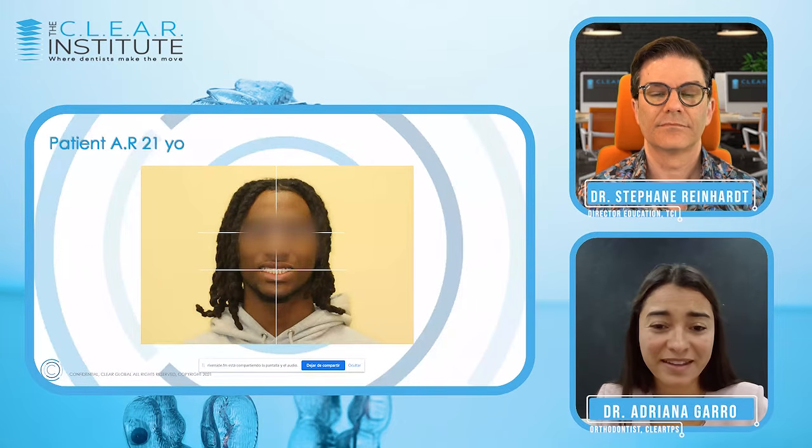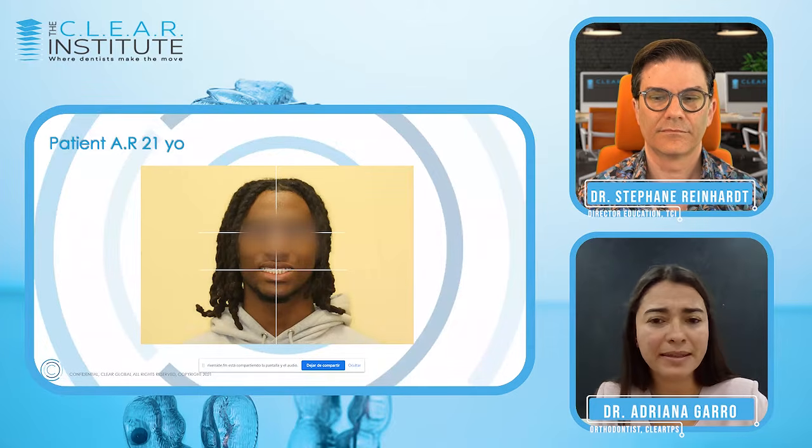It's completely different. So in this image, we see Andrew smiling, and it's more apparent that his chin, and he has a little bit of hair on the chin, but we can see more chin towards the right side than on the left side, right? So I'm already writing down that extraorally, in repose and smile, this patient seems to have a facial asymmetry on the lower third.